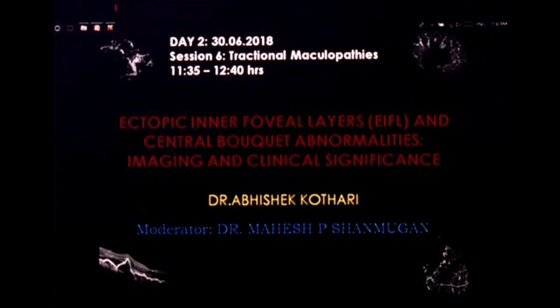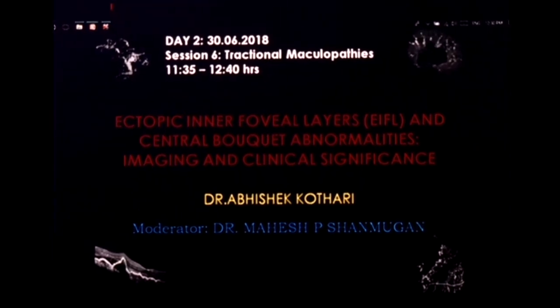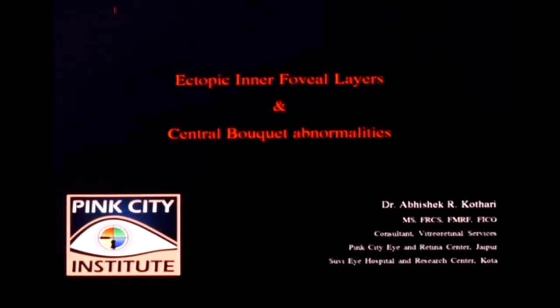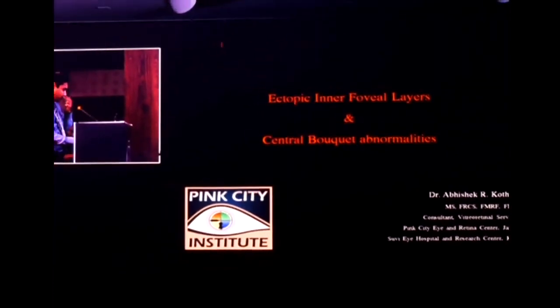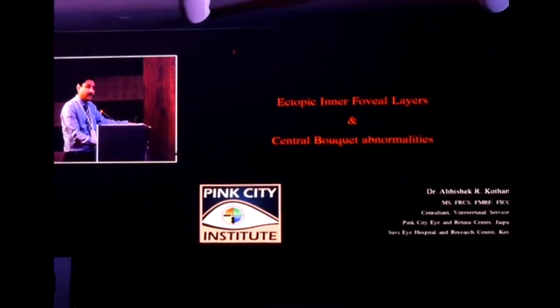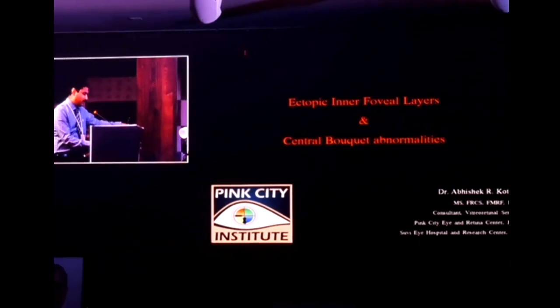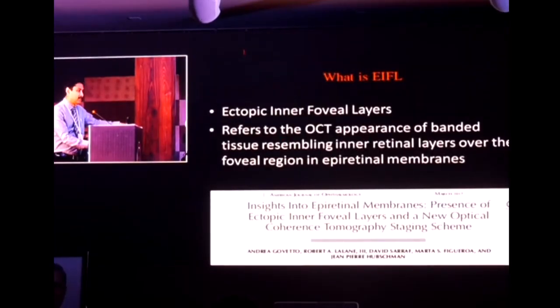To add to this conundrum of acronyms, I'm here to add two more to the basket. I'll be talking about ectopic inner foveal layers and tractional central bouquet abnormalities in patients with epiretinal membranes. So what is EIFL?